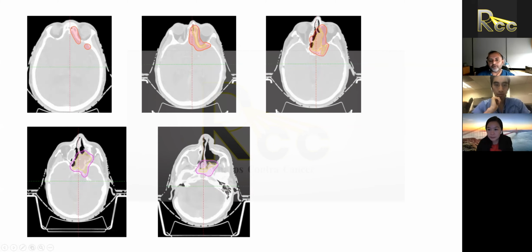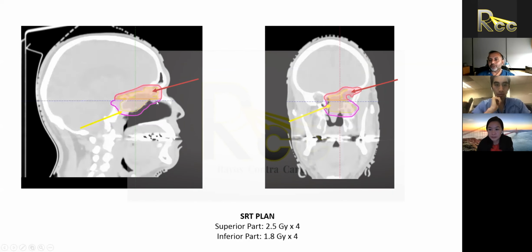And you can see this volume here. And I wanted to show you what this looked like sagittally and coronally, and you can essentially see I made this arbitrary line here. Here's the cranial volume, and here's the caudal volume. And when I designed the radiosurgery for this patient, this is modest radiosurgery, right? So I've already given 60 gray. I just need to get to an EQD2 of 70 gray in this patient.